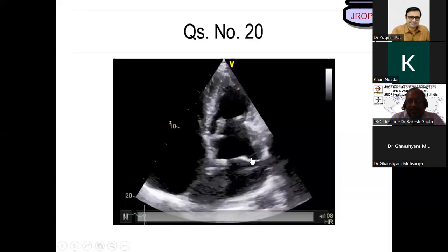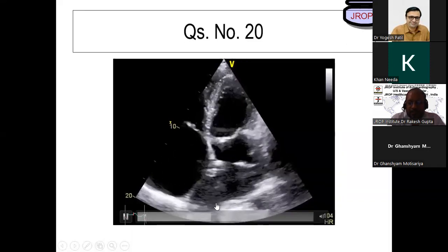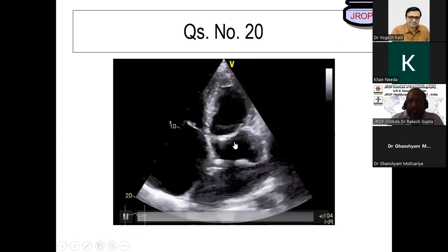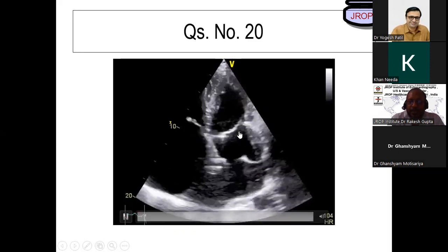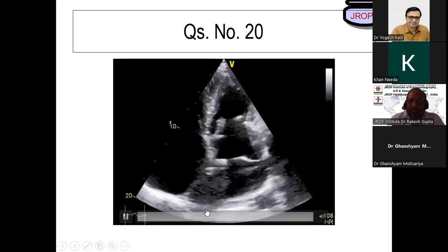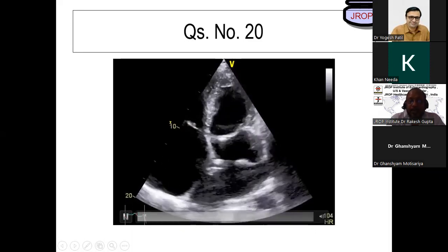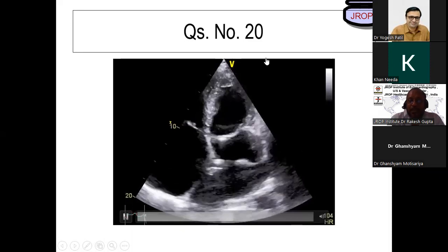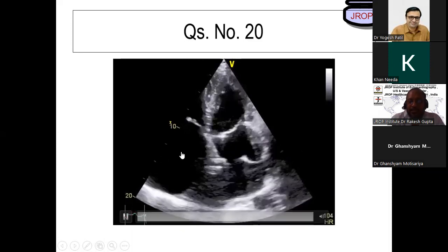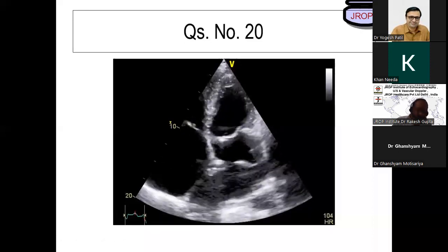So this is one membrane which is dividing the left atrium into superior and inferior structures. Superior has got the pulmonic veins, inferior has got the mitral valve, and these two pulmonic veins drain into the superior structure because normally the images are upside down. So this membrane leads to raised PA pressure, and that's why the RV is dilated. So this is classical. Nida, good job done.